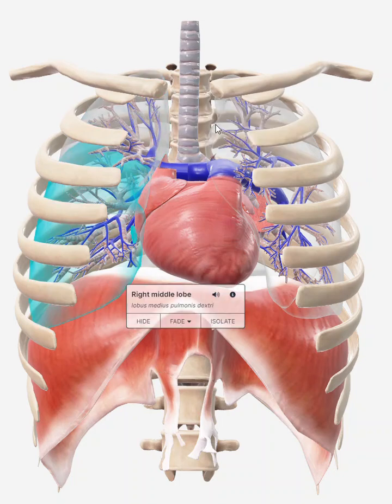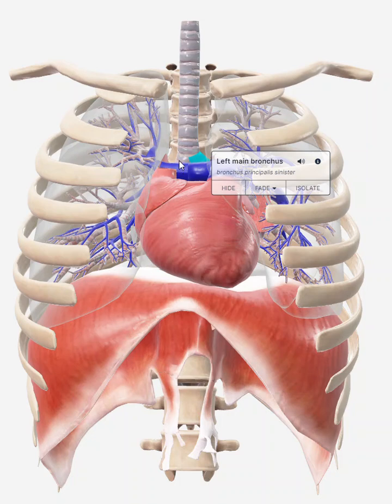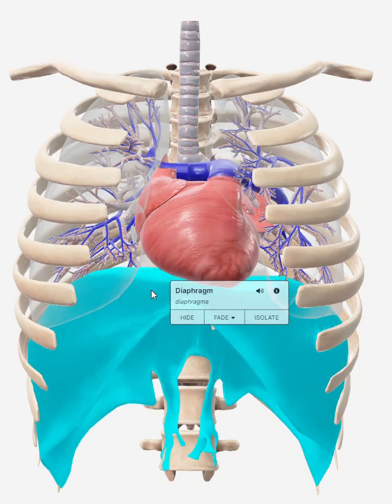You know, that's why we can see those different structures in our X-ray. Okay, so working our way down. I talked about the trachea, the bifurcation of the trachea called the carina. Talked about seeing the spine through the trachea, also seeing the spine through the heart muscle. Now we're down here at the diaphragm. So we can utilize the diaphragm to identify where the base of the lung sits on the diaphragm.